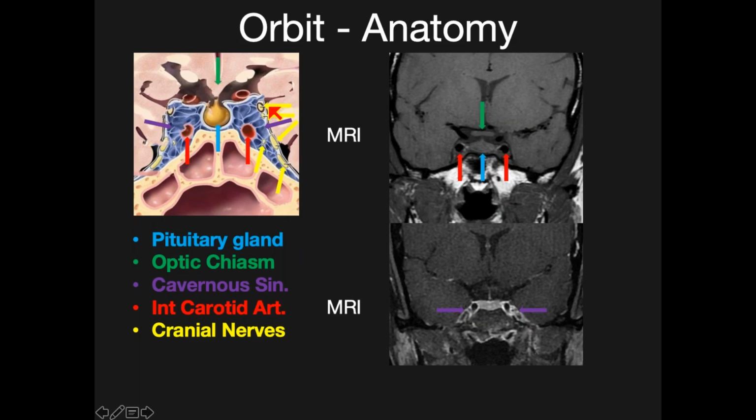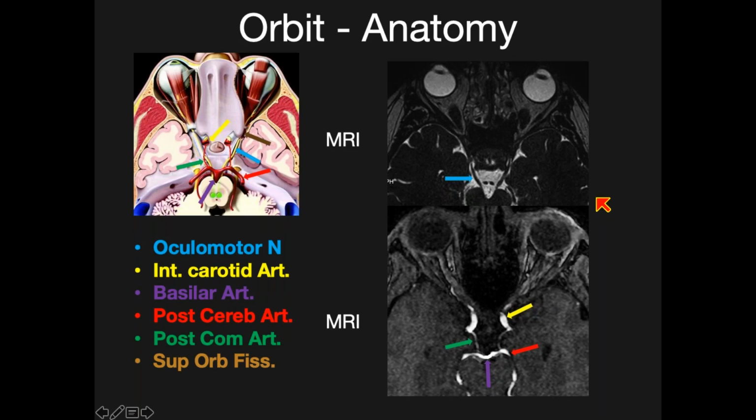This is the oculomotor. This is cranial nerve 4. This is V1, that's the ophthalmic division of the trigeminal. V2, the maxillary division, and more medially is the 6th, abducens. See the relationship to the sphenoid sinus more inferiorly. Important cranial nerves that connect to the orbits.